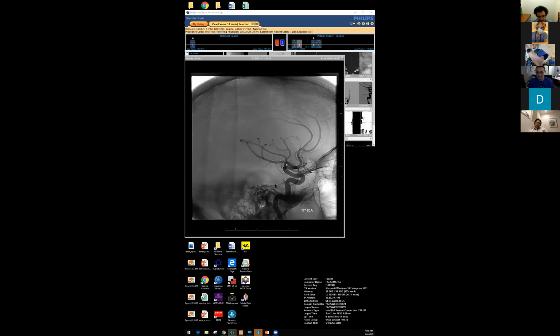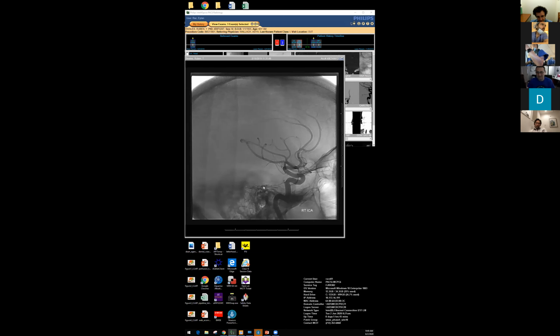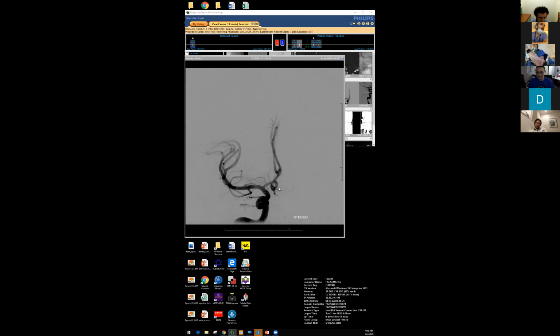So we see here the increased size meningohypophyseal trunk going along the tentorium and connecting here with a vein. We see here the start of the vein, and we see that the vein is connected inferiorly through the Petrosal Vein to the anterior pontomedullary vein.